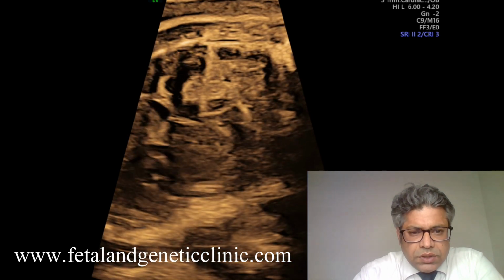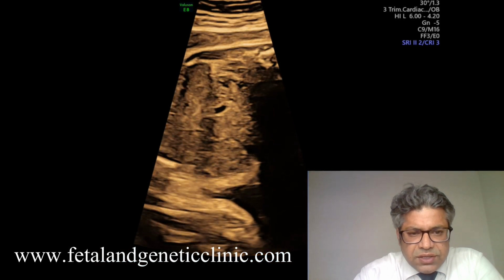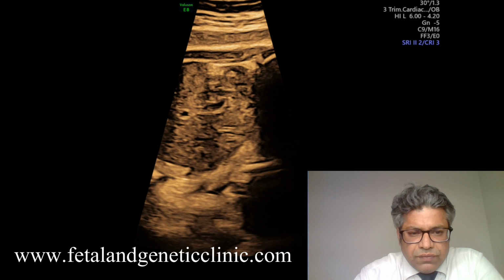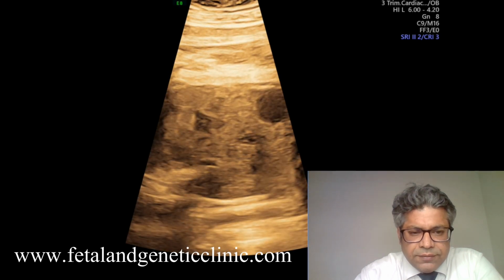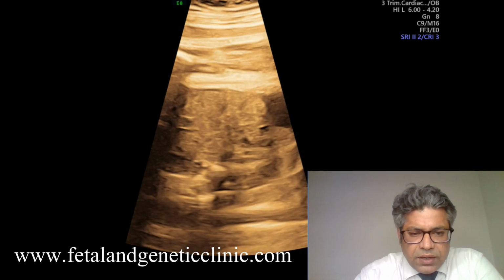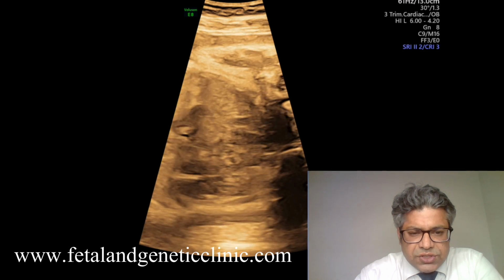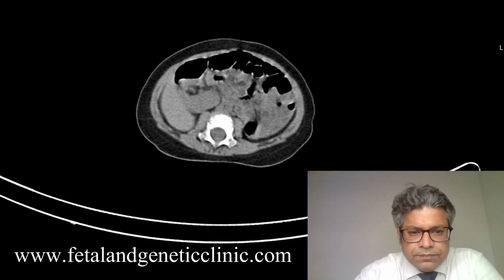It is difficult to see that the kidneys are there, but as you can see, the kidney is there and there is hardly any corticomedullary differentiation, right? So it was difficult for us to identify and delineate those kidneys. This is one of the kidneys, and then the second kidney is there. Similar finding with this loss of CMD, corticomedullary differentiation. It is lying anterior to the spine, right? They are not exactly cross fused kidneys, but the differentiation is not that great, meaning it was difficult to identify those kidneys antenatally.